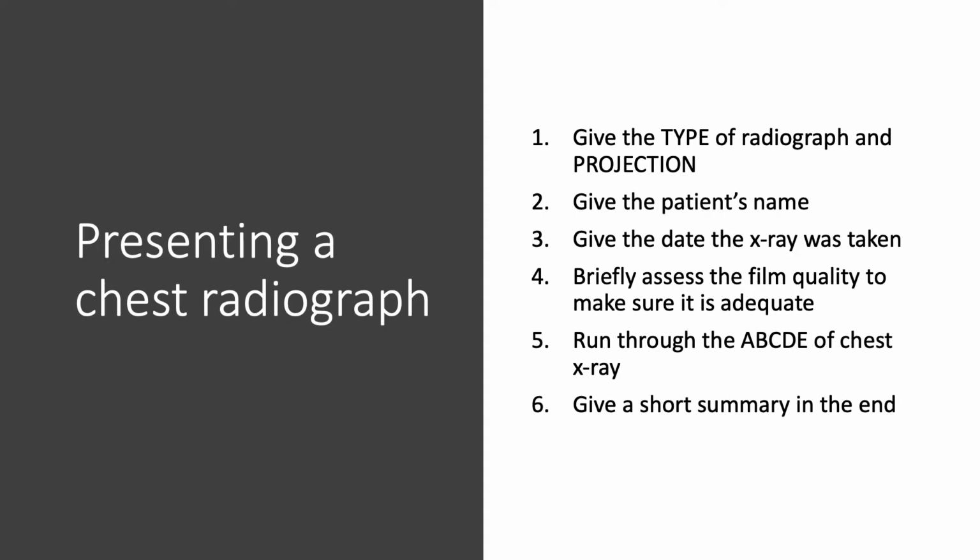After learning the normal anatomy in a chest radiograph, we now move on to presenting a chest radiograph. What is important to remember when you are interpreting and presenting a chest radiograph is that you should present in a systematic way to ensure you cover all areas and do not miss anything important. This is how you should present. Number 1, give the type of radiograph and the projection. Example, this is a PA chest radiograph.